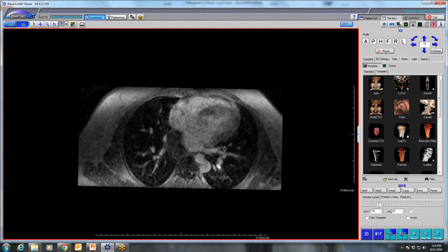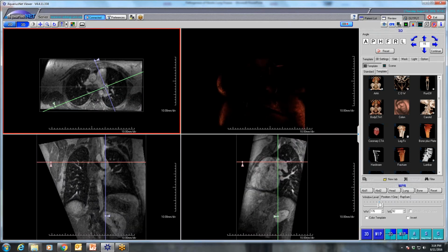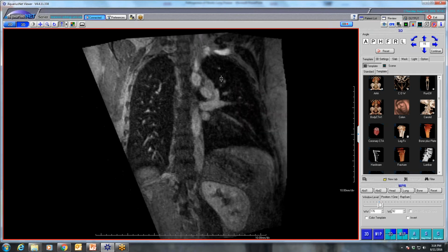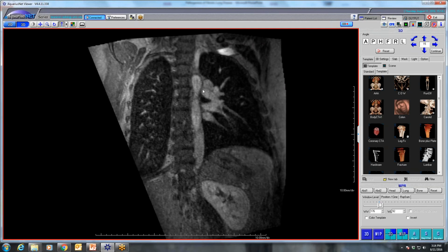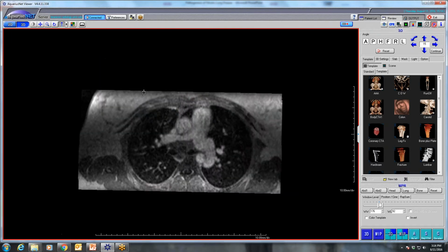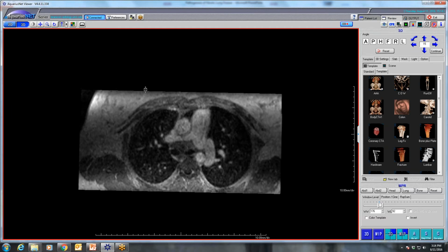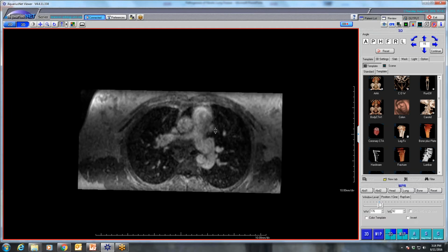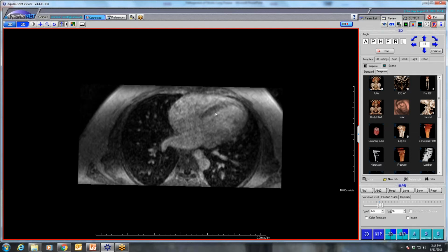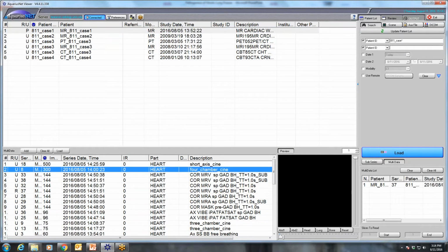And then this thing goes up and comes across and drains into a left-sided superior vena cava. So here's this thing coming up and around, draining into a left-sided superior vena cava, dumping into basically the coronary sinus. So the IVC came around, made a loop, and then dumped down into the coronary sinus, which is not seen here, but not to waste anyone's time, I'll send all the images along where you can see it on the cines and the SSFPs.